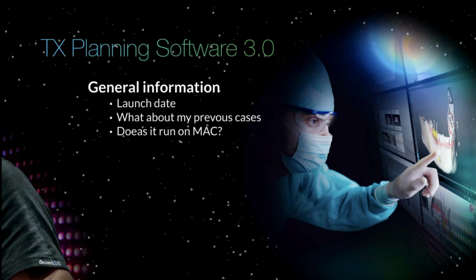The best user experience is on Google Chrome, so we highly recommend using our software system on Google Chrome. It also runs on a Mac, on an iPad, and even on a mobile device which is not older than 2 or 3 years. So it's a very accessible and easy to use system from this point.